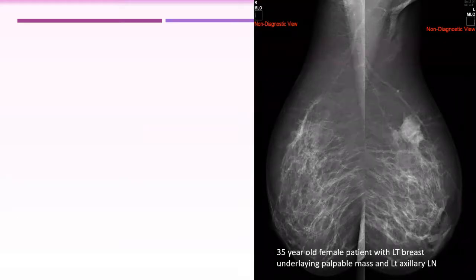Oh, we mentioned that the patient has a palpable left axillary lymph node. So why did you say no axillary? You will tell the visualized part of the axilla: does it show the palpable abnormality mentioned in the history? Because they told you there is, and you did not see the whole axilla. You will say the visualized part of the axilla doesn't show that clinically palpable abnormality. I would like to do ultrasound, searching for this palpable abnormality to make sure about it.